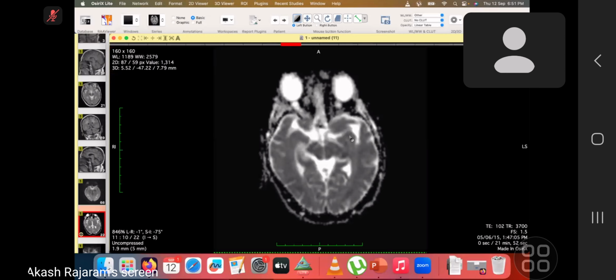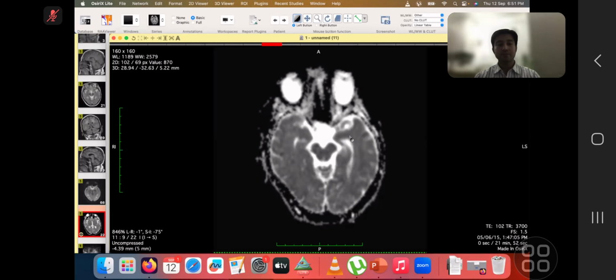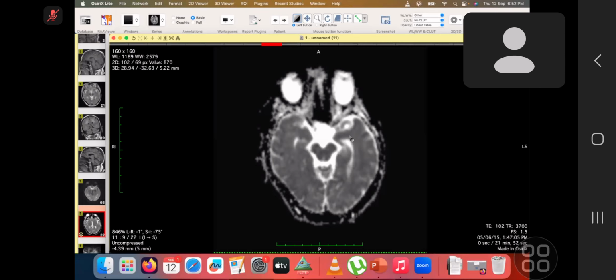And if we have any pre and post contrast imaging, T1 pre and post contrast, that would be what I'd also like to check. If not, I can provide a differential based on what we've seen. Yeah, we don't have contrast imaging. Okay. So in summary, there are bilateral symmetrical high T2 and high FLAIR signal abnormality within the deep white matter, which spares the U fibers and spares the gray matter, and doesn't demonstrate any mass effect.